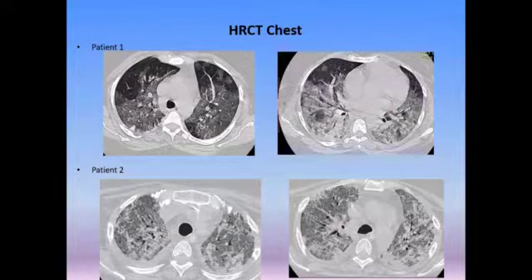So this is just for interest. I've included a few slices from the CT studies. In the earlier one, you can see this hazy opacification of the lungs, in which you can still see the vascular markings. It's actually due to partial alveolar filling, what we call ground glass. Initially you tend to see it more in the lung peripheries and in a patchy nature. But as the disease progresses, it worsens, and you get these diffuse ground glass opacities.